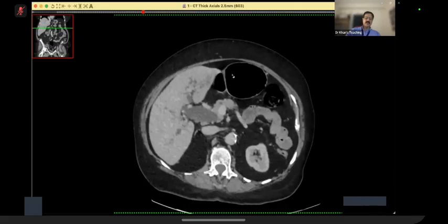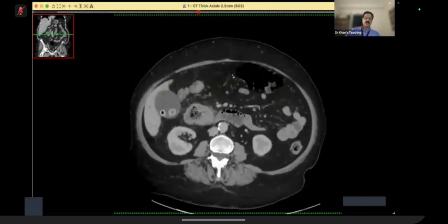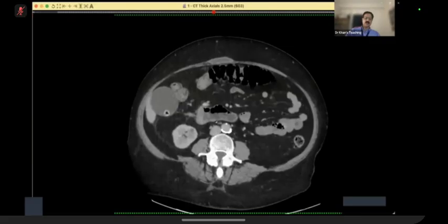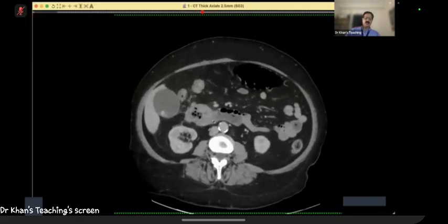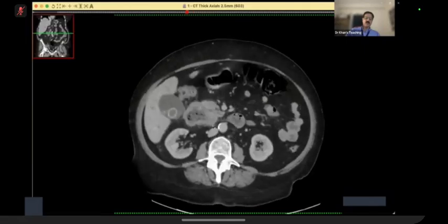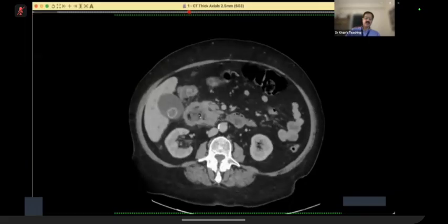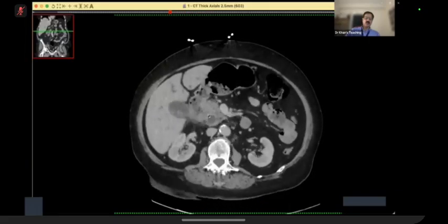And the key thing is the art of developing the epicenter. This is what it is, the fine touch. Now, this is the D3. We are coming upwards, and you can see the same thing, that the duodenum has got a stricture, and this thing is in the lumen. The same thing which I showed you on that MR.